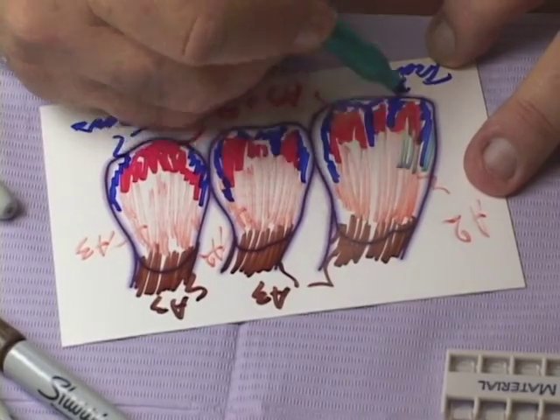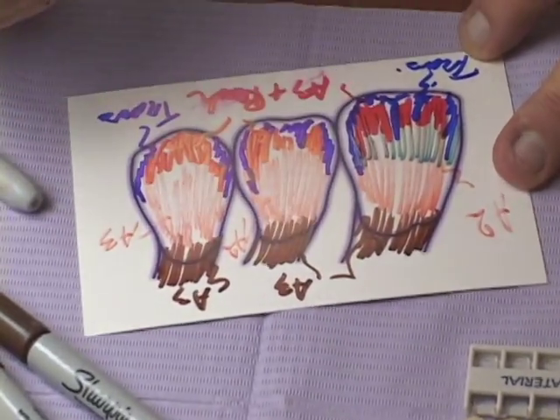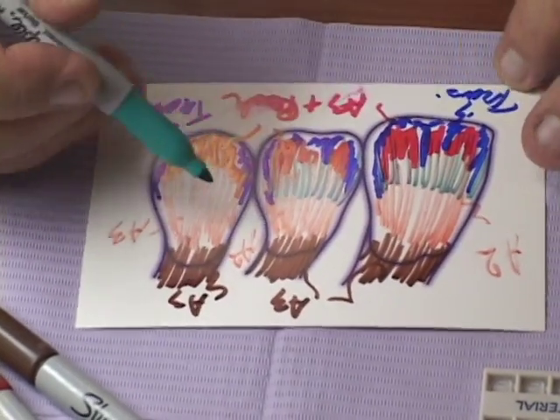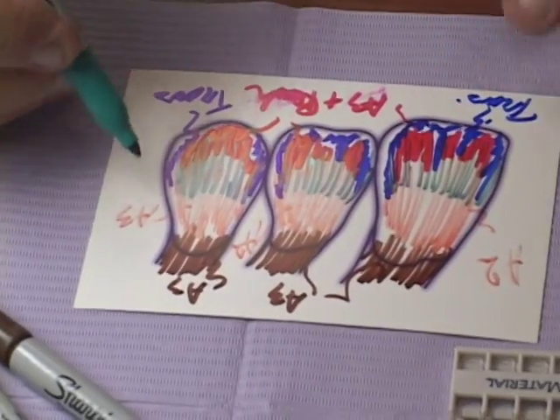The next thing to establish is the enamel color and how much of the enamel is covering the tooth. In this situation, the enamel that is visible is covering approximately half of the tooth. So that will be marked with a green. Green represents a lighter enamel.